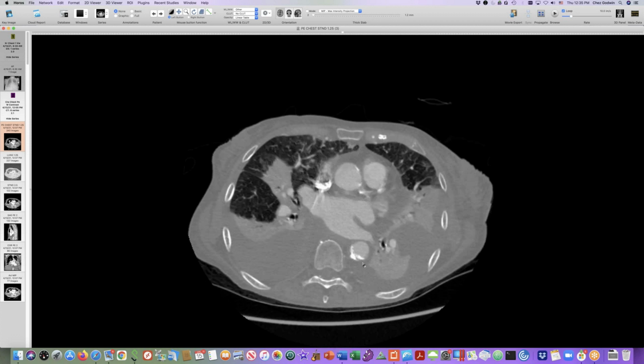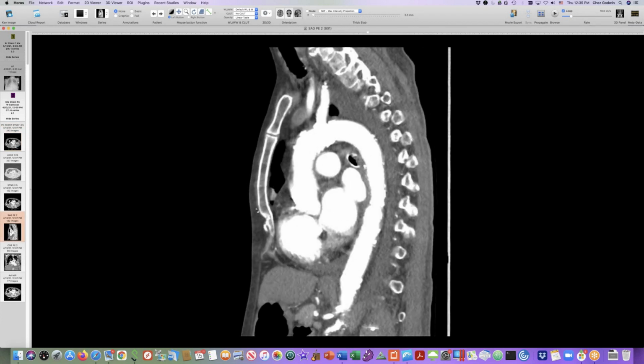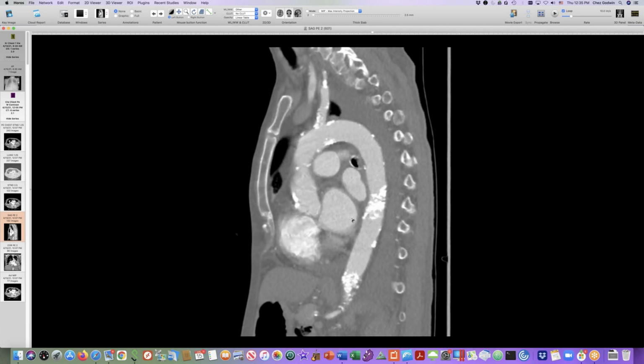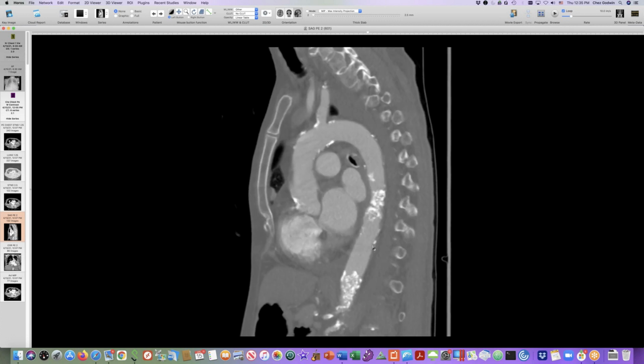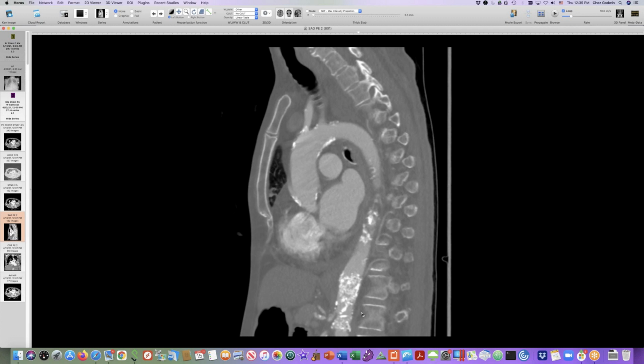And there's another round of this stippled calcification, which is not just in the lumen, but seems to be internal all the way through the lumen. But obviously the aorta is not being obstructed by this. It's not that dilated. She does have heart failure, and she's got this funny stuff that seems to be in the lumen, but is non-occlusive. So people were thinking of what sort of tumor could this be? It doesn't look like calcification and thrombus.